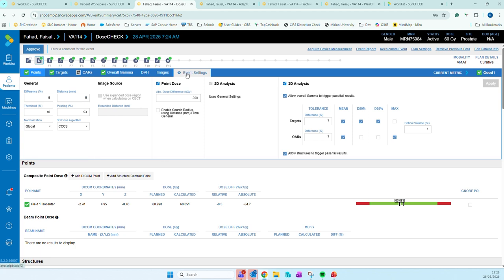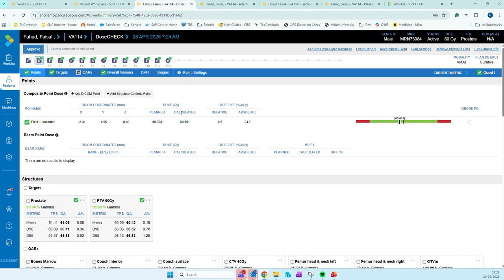So this is the secondary dose calculation of the initial plan. And this is the first bit of functionality that would be included in the AdaptCHECK package. This package was designed to match what Mobius Adapt does, but hopefully have some additional things in there as well.